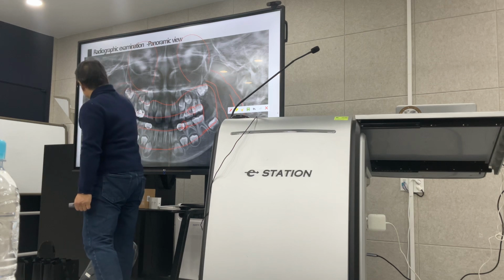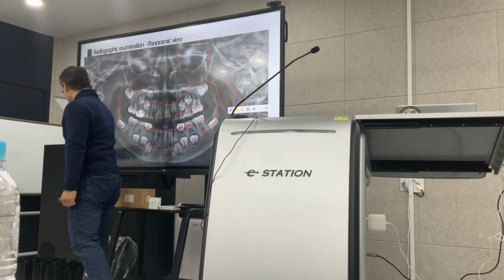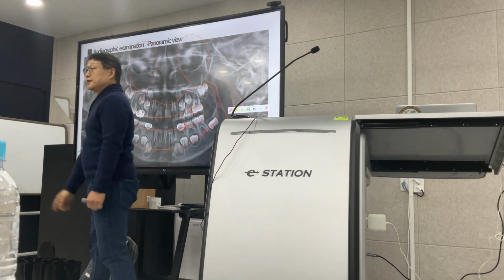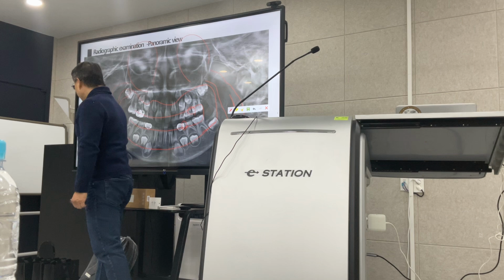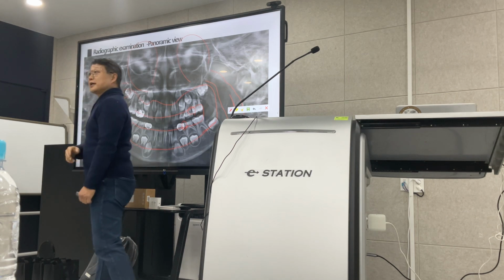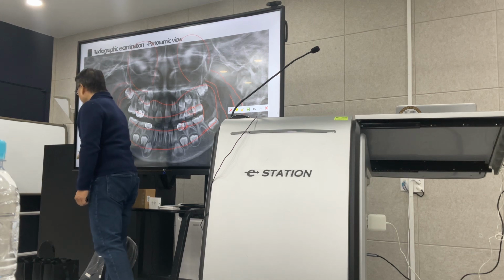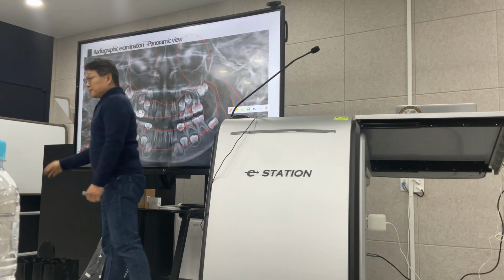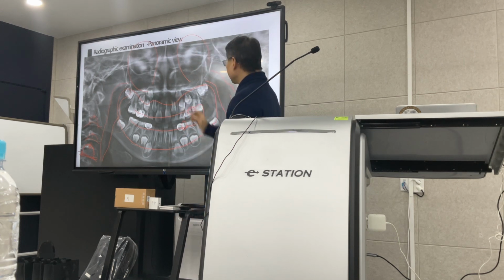You can see second vertebra, third vertebra, fourth vertebra. Flat means they are still young. If the vertebral shape is like that, they are older. So second, third, fourth vertebra will be called... they mean almost 15 years old. So we can see it this way.